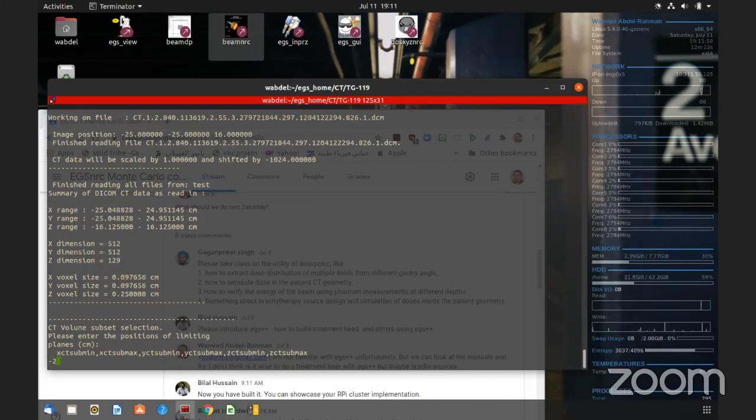So I would just put -25 up to 25, and then for the Y it's going to be -25 up to 25, and then for the Z I'm going to put -16 up to 16.